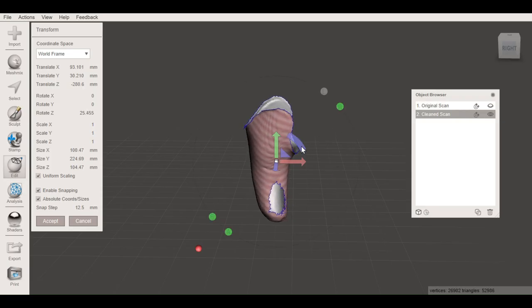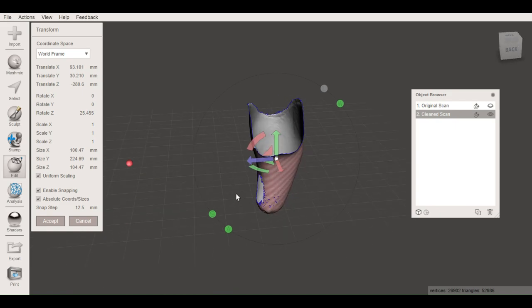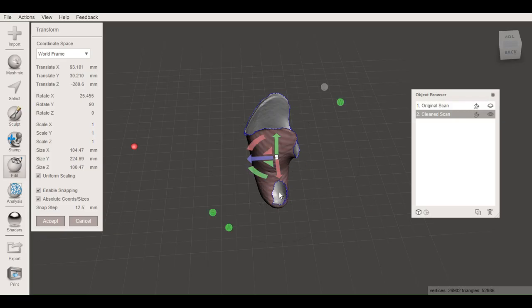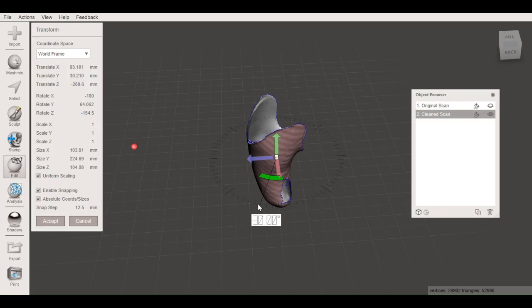So we'll use the arcs to move the model in the direction that we want. And as we use these arcs, you'll notice that if I stay in close to the arc itself, I can go by any amount of degrees, and you can also notice this over on the left-hand side here. If I move my cursor outward to where it picks up the grid rotation points, I can go by increments of 5 degrees in order to rotate the model.